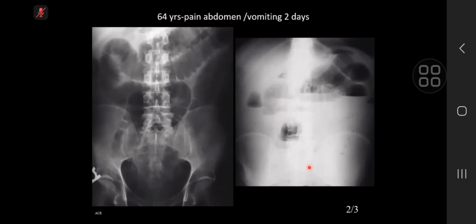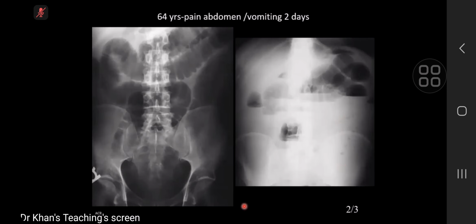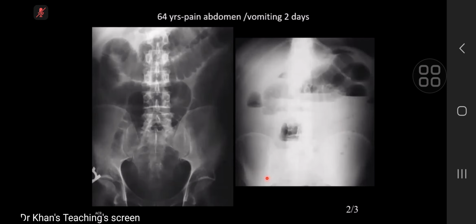So there's quite marked opacification in the mid to lower abdomen, with almost like a fluid level visible across the bowel. Excellent. And what is this where I am pointing out? Looks like gas within bowel. So there is a sign. I'm waiting to hear that sign. And that sign is considered quite specific for intestinal obstruction. I'm not sure. Okay, fine, no problem.